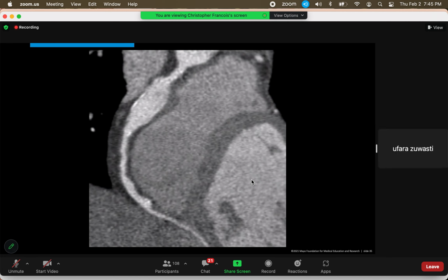So I think in this case, if the previous one is more on the atherosclerotic disease, this one is like vasculitis. Yes, exactly. Back when we had oral exams, the way you would have said the diagnosis would have been to say, if this patient is 15 years old, this is Kawasaki's disease.